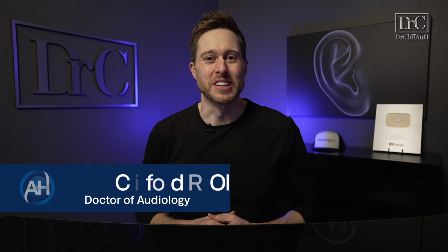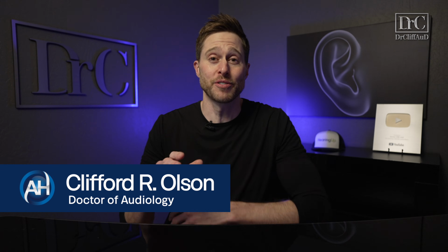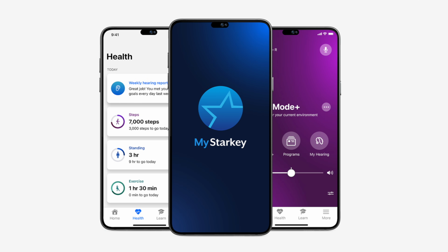Hey guys, Cliff Olson, Doctor of Audiology and founder of Applied Hearing Solutions in Phoenix, Arizona, and in this video, I'm giving you a detailed tutorial of the MyStarkey hearing aid app. Hearing aid manufacturer Starkey is very well known for having one of the most feature-rich hearing aid apps on the market. Now this is great if you're a tech-savvy individual, but if you're not, it can be a little confusing, but it doesn't have to be.